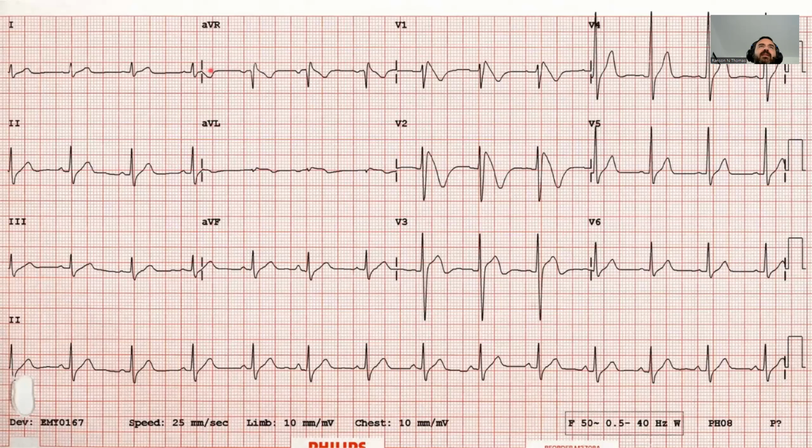So it's not like this is one lead and then it switches over to this new one. And you can kind of tell that just by looking at them and how the waveforms match up to each other. It's not like this is one continuous thing, and it's switching between leads. This is the same length of time, same length of time, everything.